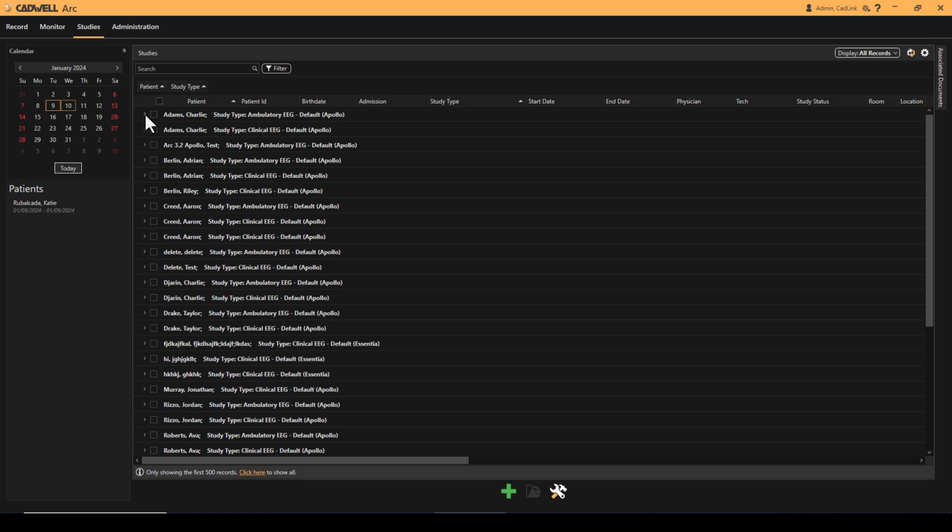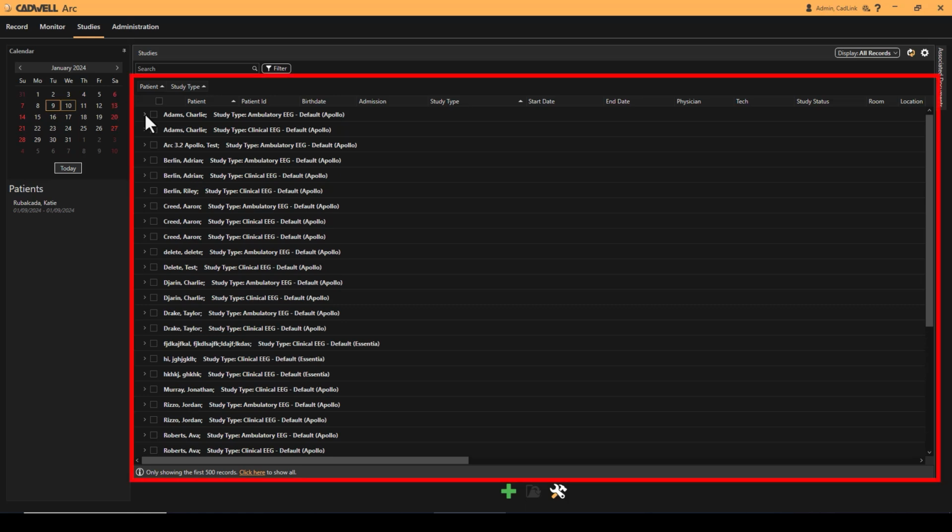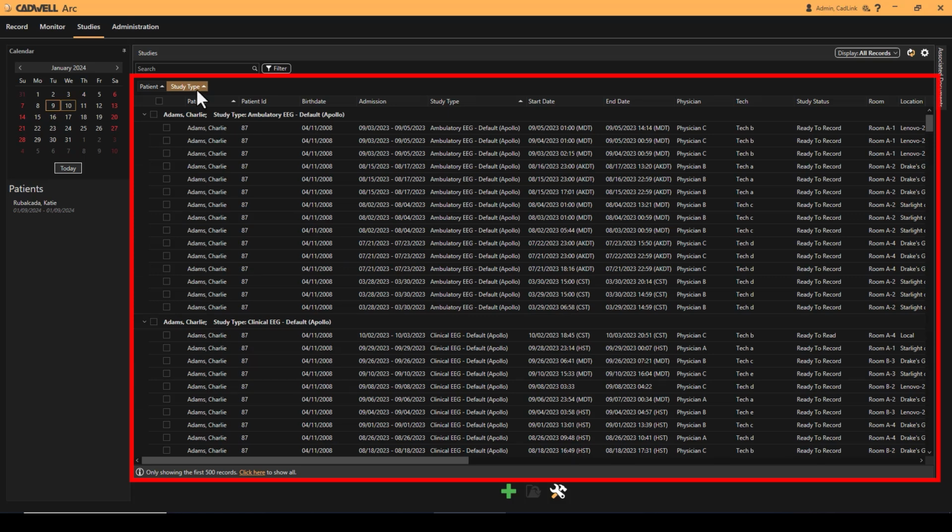By right-clicking on an applied grouping, you can choose to fully expand, which will expand the grouped studies in the study list, showing the study header and the associated files. You can also choose Ungroup, which will remove the applied grouping.